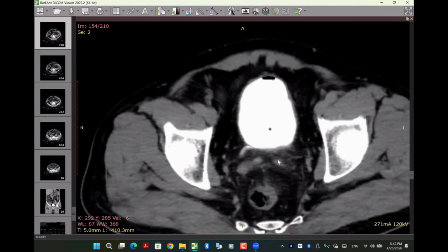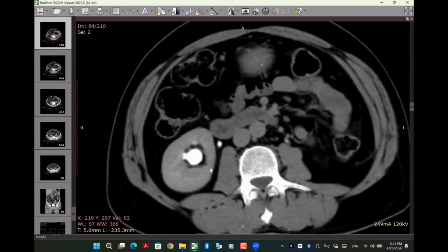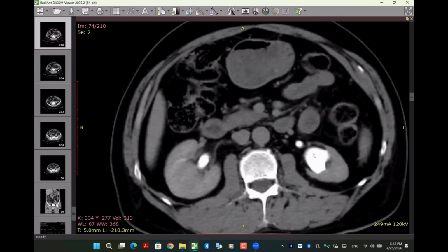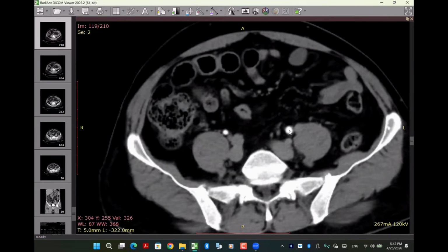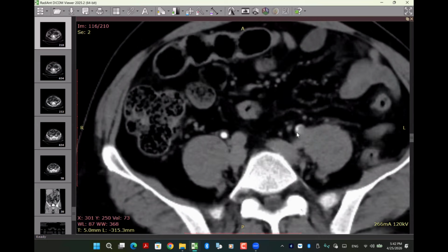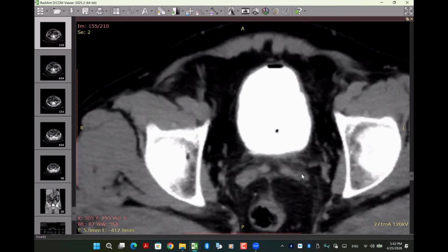And on the delayed image, you should highlight the entire course of both ureters, both renal pelvises and the calyceal system as well. Okay? It could be a renal pelvis lesion, or multifocal, or even a single focus inside the ureter like this one. You got my point? If you see something like that, you should ask yourself: is this an ascending metastatic process from an underlying urinary bladder lesion, or even extension from a prostatic lesion, or is it a primary pathology inside the ureter?